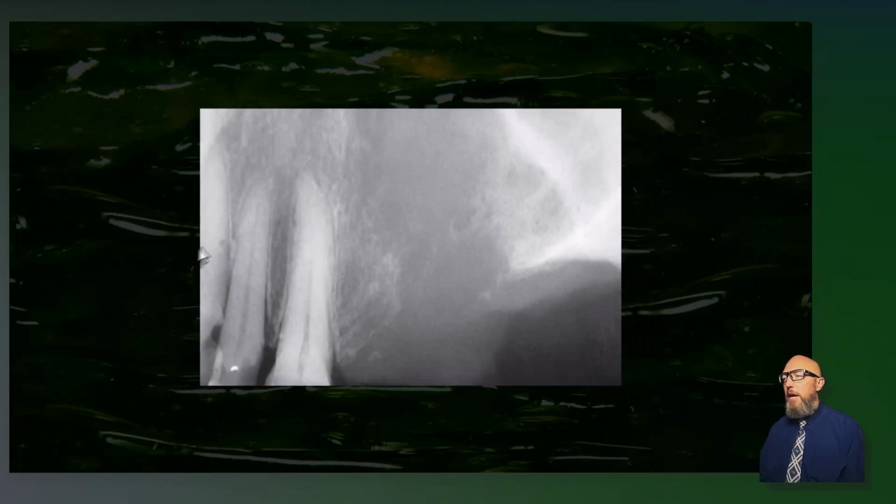So here's the imaging of that patient. How would you describe this lesion? Is it well-defined and corticated? Is it ill-defined and ragged? What does that mean as far as category? That's more of a malignancy. Hopefully you can recognize that with the imaging, even though we described it as slow and maybe it felt like an indurated swelling. So here's one where imaging tells the whole story almost.